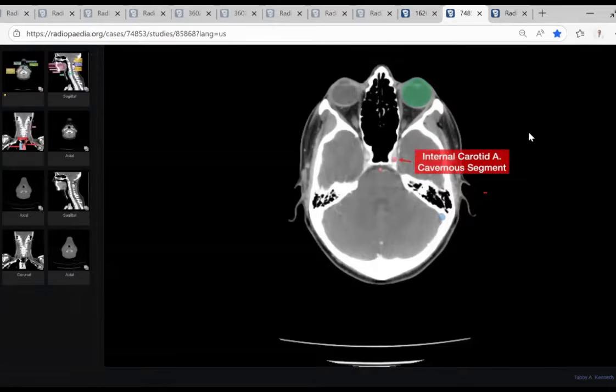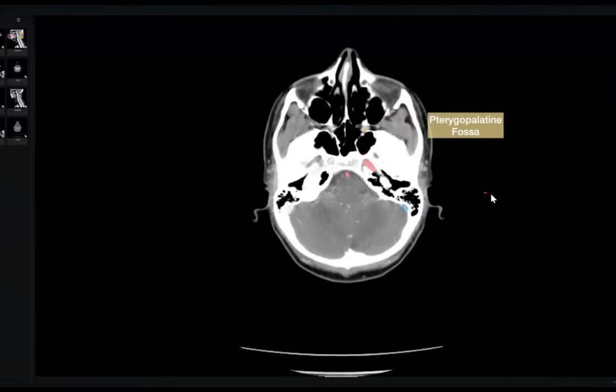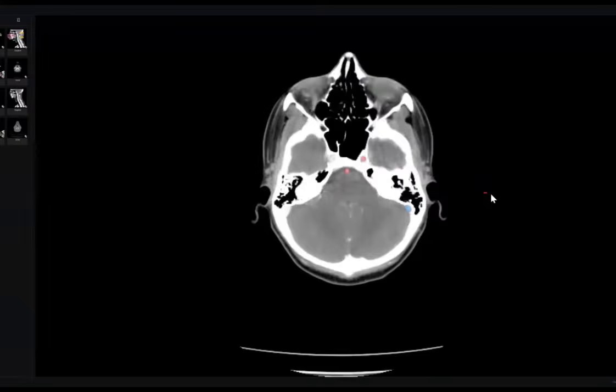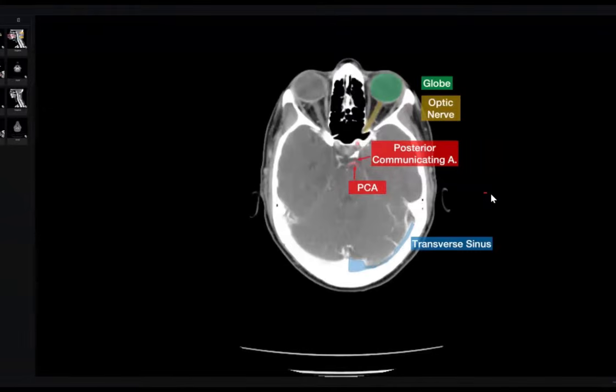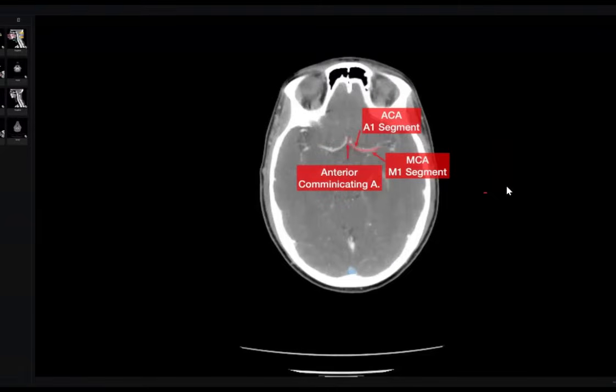Look here, my colleague. This is the circulus of Willis. Very important in any exam. And this is a pass or fail question if you miss one of this anatomy. This is ICA, okay? And many of the CT is normal, and only the ICA is occluded. Follow it, please. What happened? Follow. These are different segments of ICA. Up, it is bifurcated into 2 parts after the supraclinoid part, into the MCA and the ACA.